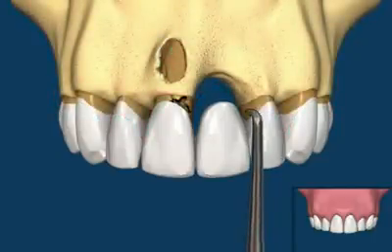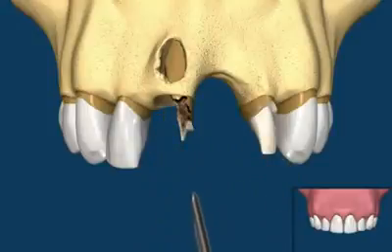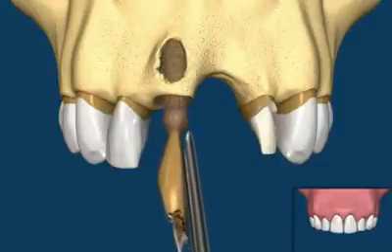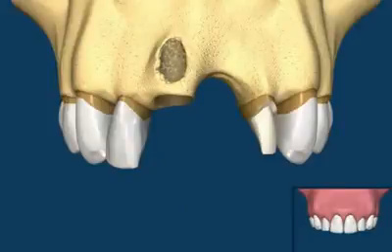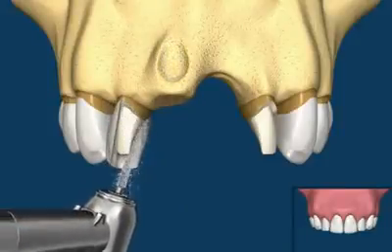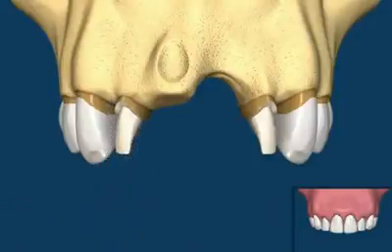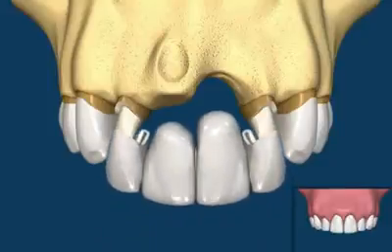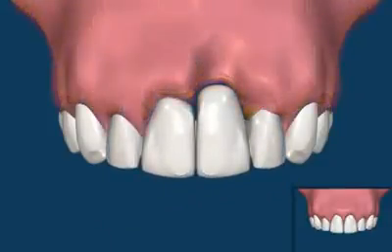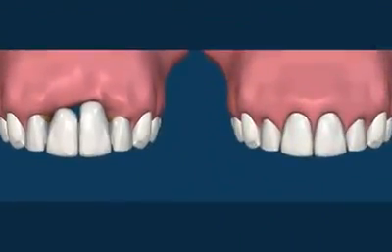Below the gums, we have bone destruction. The only solution at this time is to remove the bridge and the destroyed tooth as well. To continue with the bridge option, we again need to cut down another tooth and make the bridge bigger. A 4-unit bridge can then be placed on the two prepared teeth. This bridge will not look as good as the original due to the bone loss. The process of atrophy will continue as before.